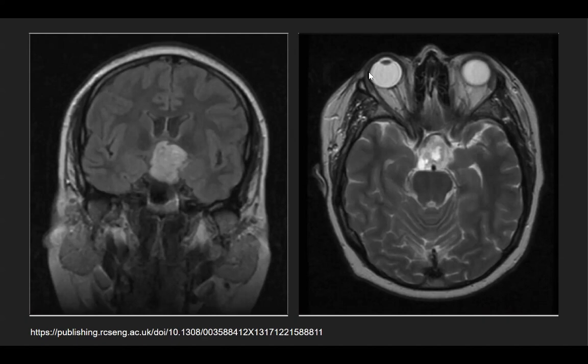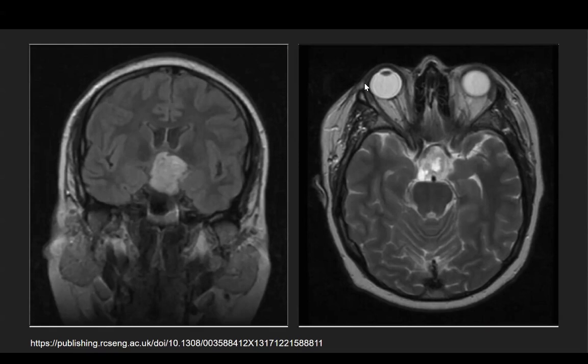I think I would probably consider differentials of optic chiasm glioma or craniopharyngioma. Maybe an upward invading pituitary macroadenoma. I will go with craniopharyngioma because it's cystic and solid. Yeah, it's a small cystic component at present. Dr. Fatma has written it could be cranio, it could be pituitary neuroendocrine tumors, it could be germinomas. That's right. It could be either of those.